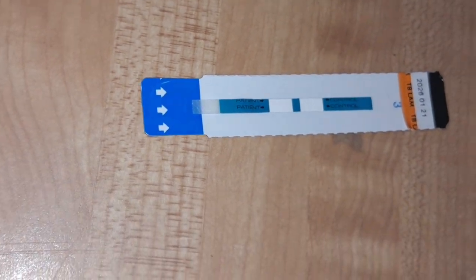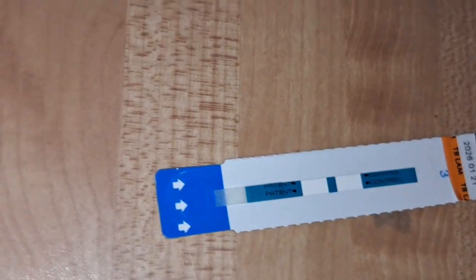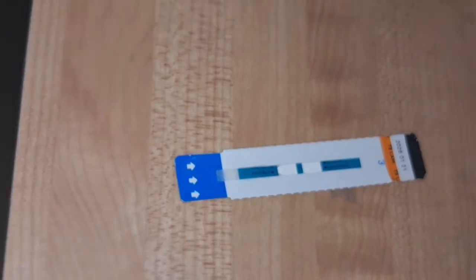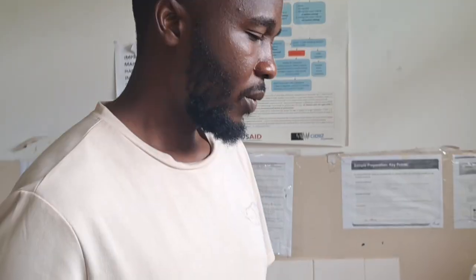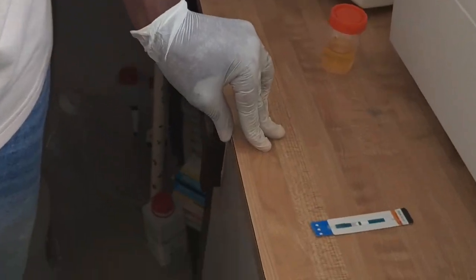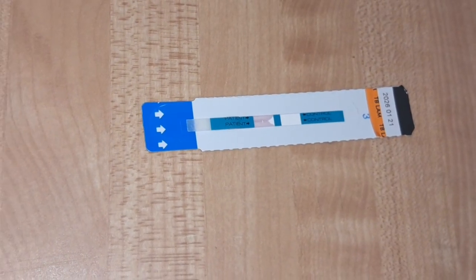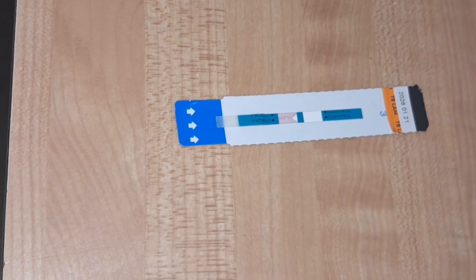I have a question. When you put this big drop here, how long are you supposed to wait for these results to be read? The good part about RDTs is that they are not like the other ones which you wait for hours. For LAM, you only wait 25 minutes, not less than 25 minutes. After 25 minutes, your results will be ready for interpretation. So let's wait for our test to run. After 25 minutes, we'll continue the video so that we interpret the results together.